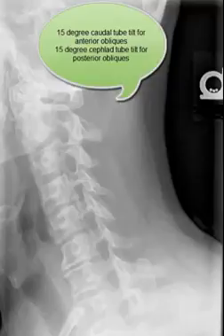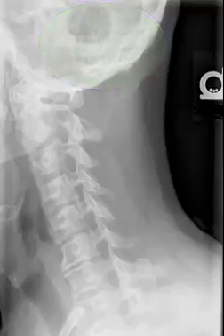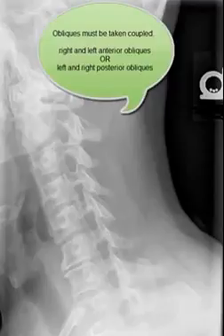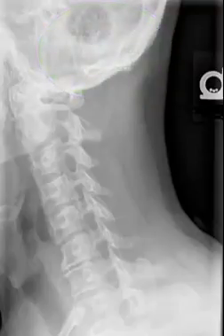And so when you're in practice, you have to position the patient to the best of your ability, whether that's in an anterior or posterior position, and remember to take both sides, left and right, either anterior or posterior, as a couple. Now, oblique projections are named for the portion of the body that is touching the bucky.